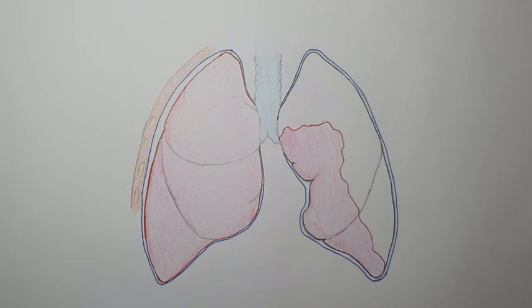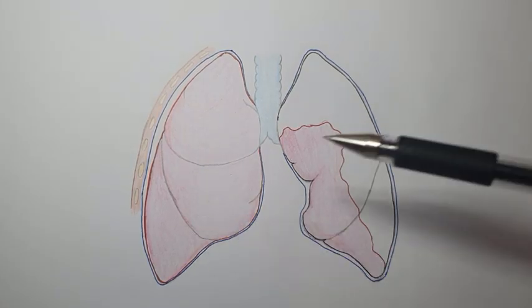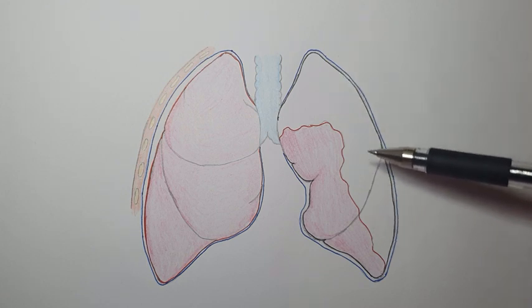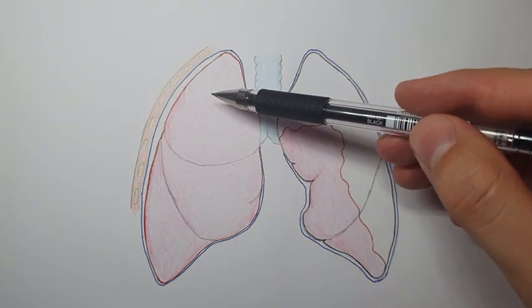Hello. So before we look at the X-ray examples, we will first analyze some important details in lung anatomy, and what the factors and anatomical features are that are important in analyzing pneumothorax later on X-ray. So here we have two lung fields, the right lung field and the left lung field, which has some pathology on it. So first of all, here is the rib cage and here is the lung.